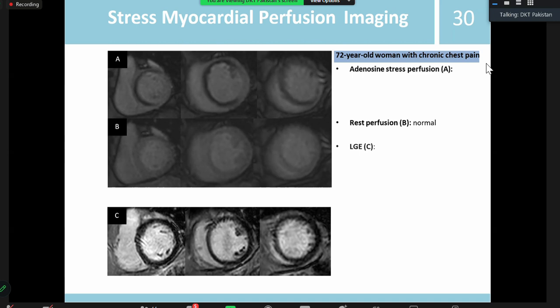Okay. You are saying this is an old infarction. Old infarction will be visible on which image? On which sequence is it? Old infarct, one is that it would not show late gadolinium enhancement. No, chronic will show. We saw a case of chronic infarction, which was the first case we were showing, late gadolinium enhancement. Okay, I will correct you.